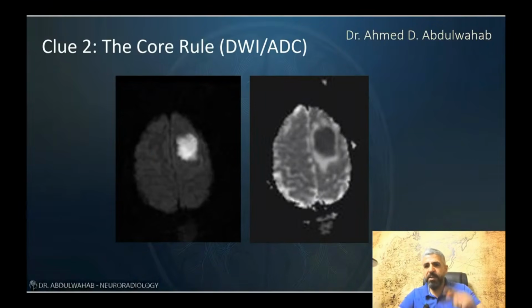And this, detectives, is your primary diagnostic weapon against bacterial infection. Look at the ADC. The entire core of the lesion is black. Low ADC means intense restriction, true restriction in nature. Is this a GBM or is it an abscess? The center is restricted here.